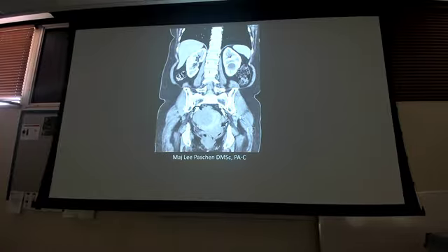But now we're going to jump into the abdomen. I know you've covered some abdomen stuff in pathology, so now we're actually going to teach you what pneumoperitoneum is and what happens when there's free air under the diaphragm and all that other kind of stuff. What you're going to see a lot of is that X-ray again is our initial study, but CT a lot of times is going to be our study of choice, except in certain areas, so start paying attention to that, because certain things are ultrasound instead of CT, and we'll take a look at that, all right?